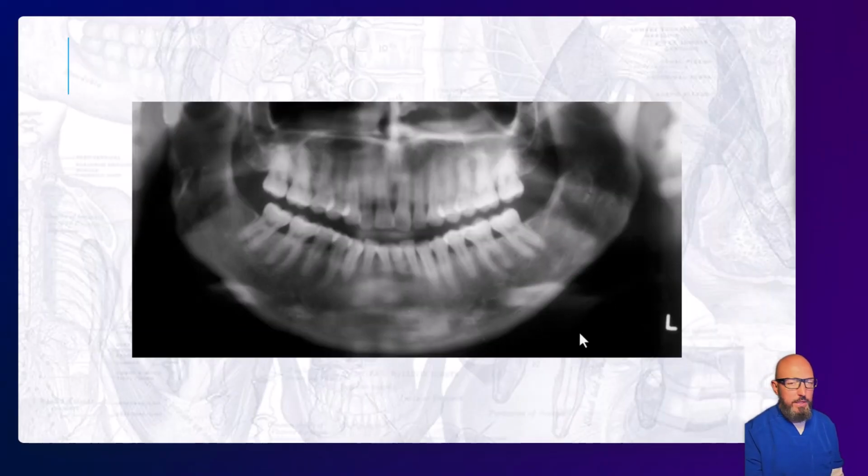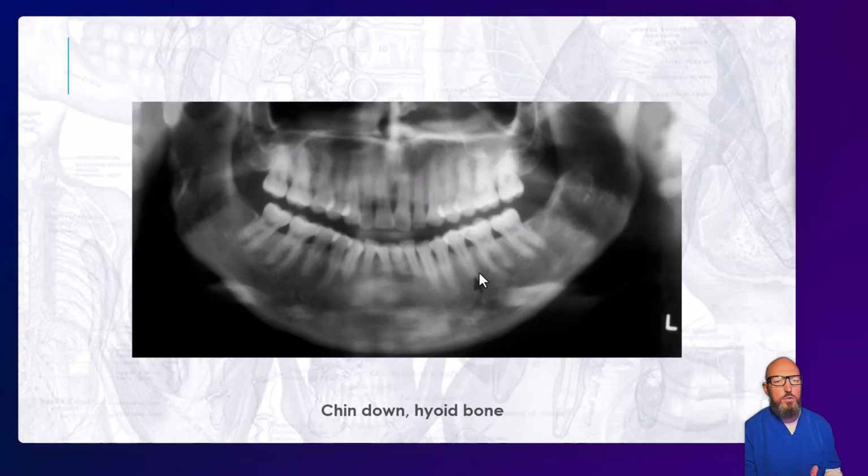This one, hopefully easy to recognize. The chin is down too much and we're kind of cutting off the mandibular teeth. That's why they just kind of disappear here. It creates this illusion of a lesion in the anterior mandible. So be aware of that. Sometimes the teeth are just not right in the focal trough, and that's not always a pathological lesion.